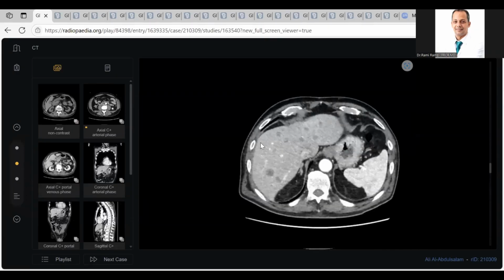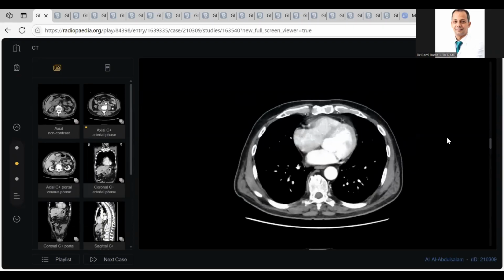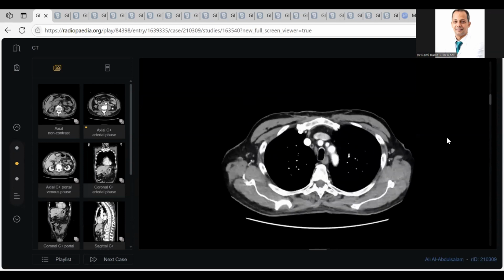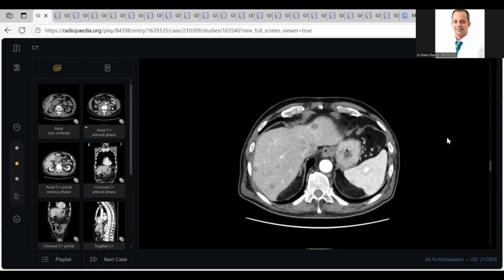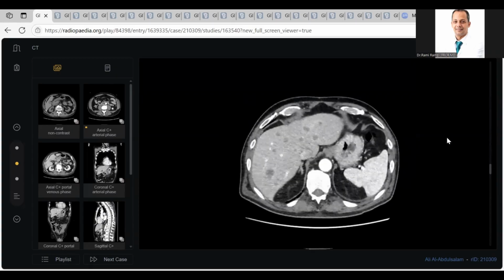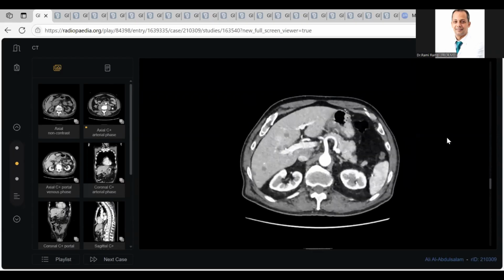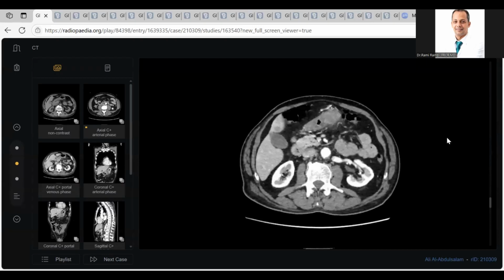So these are contrast enhanced axial CT sections in the early venous and the late portal, late arterial phase. There is redemonstration of multiple low density focal hepatic lesions involving both lobes of the liver. I would like to see the arterial phase if available. However, the findings are suggestive of, more likely favoring, metastasis. I am looking for the primary.